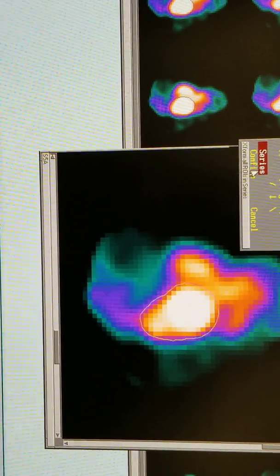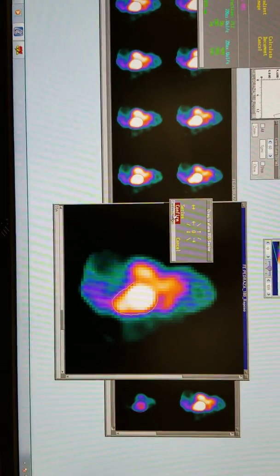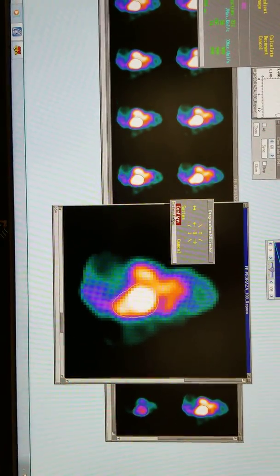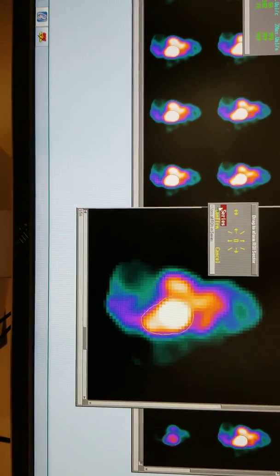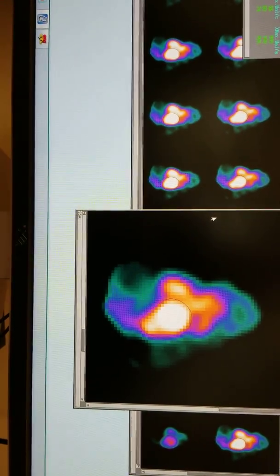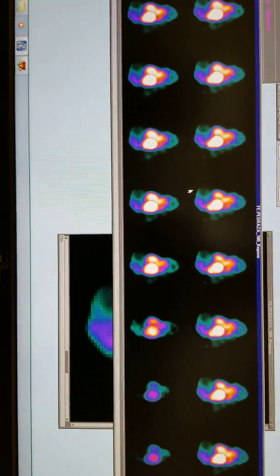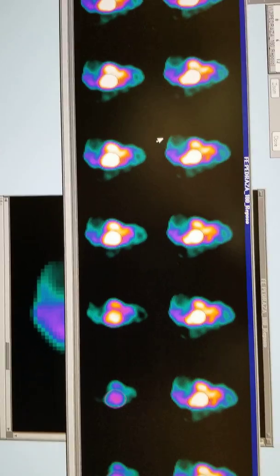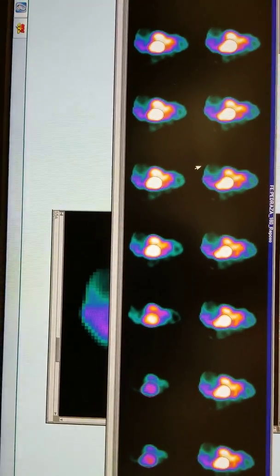We do not want to do series for this. So as a reminder, we just wanted to adjust this specific frame. We are not going to click series. See that? No check mark. Check mark is bad now. Confirm it. It should change just that one frame. Now double check what we're doing. Go back through all of your frames. Make sure that you're reasonably happy. Again, try not to shoot for perfection. You'll blow your 22 minutes.